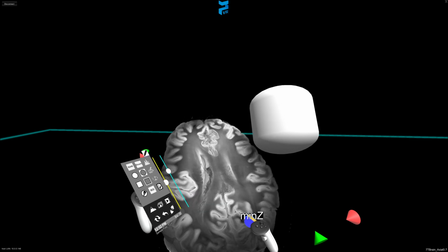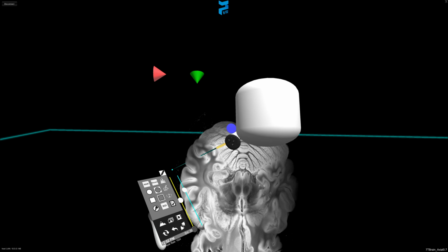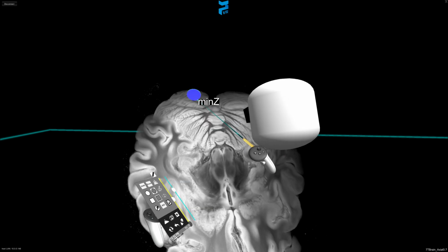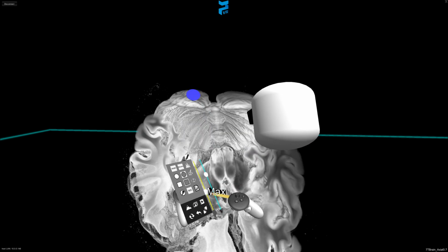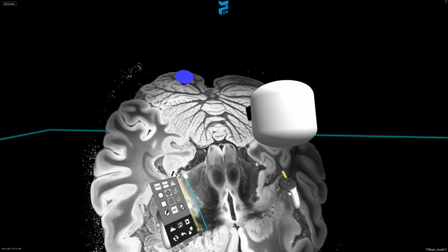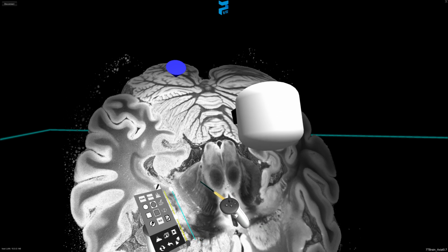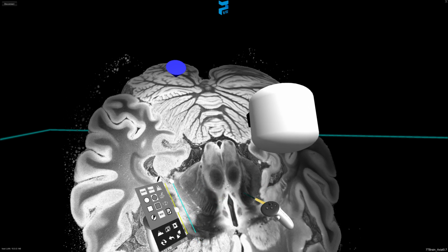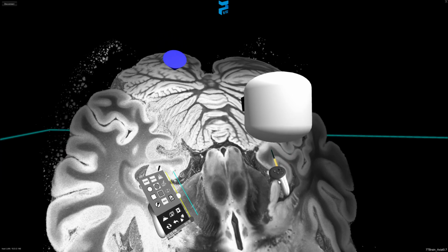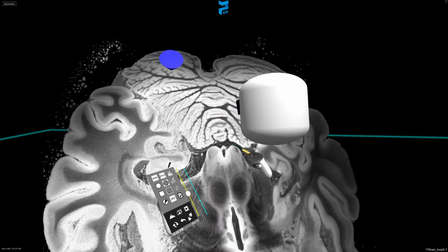As I cut down this axial plane, I can begin to orient my image such that I have anterior down and posterior up here, and I've cut into the level of the midbrain. Again, I can continue to window my data to bring in and out different nuclei, and I encourage you to take the chance to look at different features and identify nuclei within each of these levels of the brainstem. Most importantly, though, we have those cerebellar peduncles found here and here, the mesencephalic aqueduct in this center area here, as well as the superior and inferior colliculi on that posterior aspect here and here.